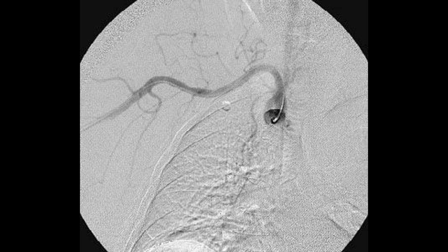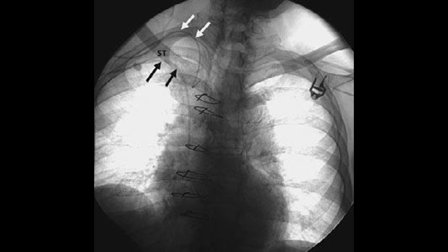Arterial placement of a central venous catheter is an uncommon but important complication. It may occur following direct arterial puncture or inadvertently through a transvenous fistulous connection. While sometimes benign, it can lead to significant complications if a large bore dilator or catheter is advanced, including arterial dissection, hemorrhage, pseudoaneurysm, or stroke.